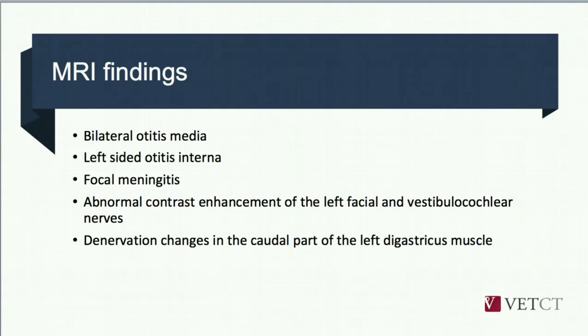In conclusion, the MRI shows the presence of bilateral otitis media with left-sided otitis interna and intracranial extension resulting in a focal meningitis. There was abnormal contrast enhancement of the left facial and vestibulocochlear nerves, and secondary denervation changes in the caudal part of the digastricus muscle.